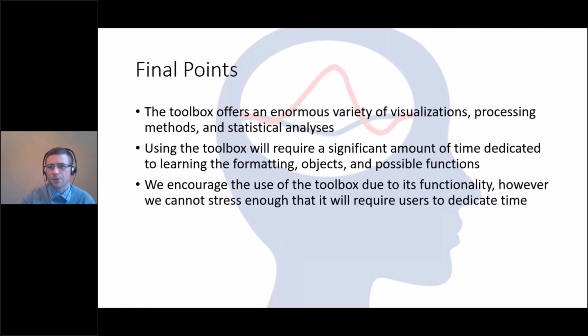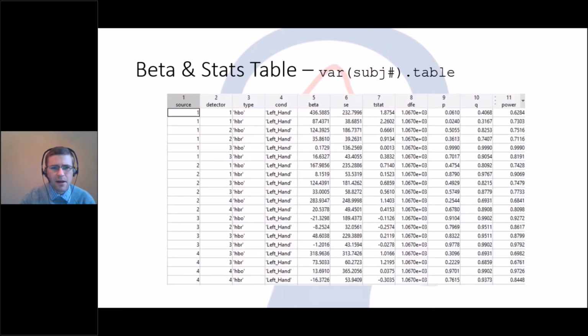My vocabulary is horrible, so forgive me on this, but I believe those are not far off from each other. SE is standard error. And again, my vocabulary is terrible. I'd have to do a quick Google to verify that. But I believe you'd see it on this column 6 here in the table. And again, I need to verify that standard error and residual error are the same. So forgive me on that.